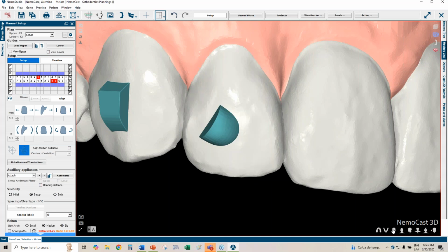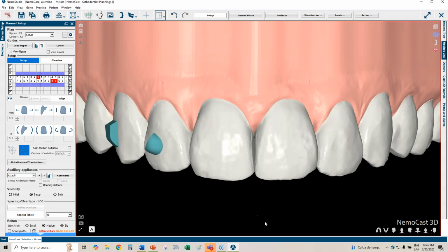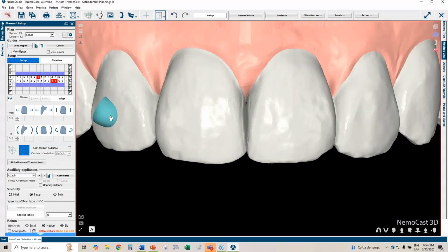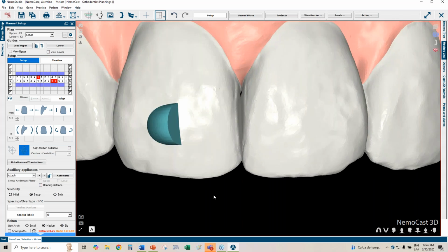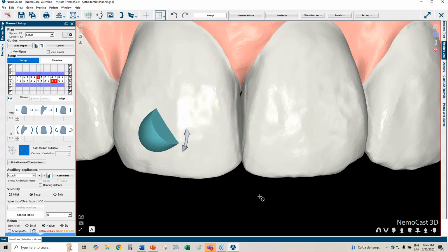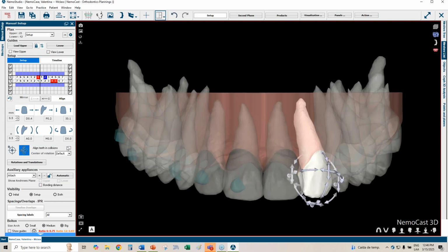Delete object. Here, let's remember that the retrusion was as well the position. This is a flat tooth. So, for example, 15 degrees of distal rotation is not going to be too much, but we can follow the same recipe for this one. And this one could be like that.